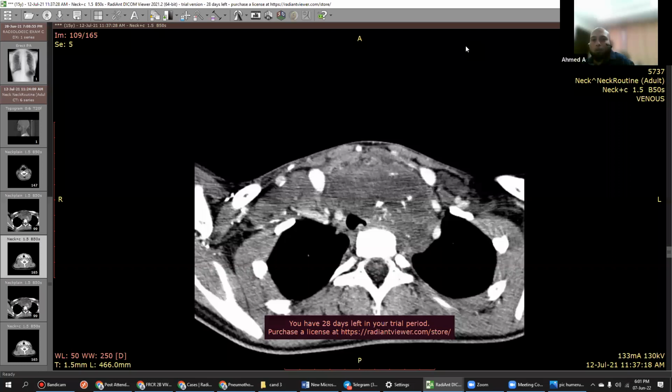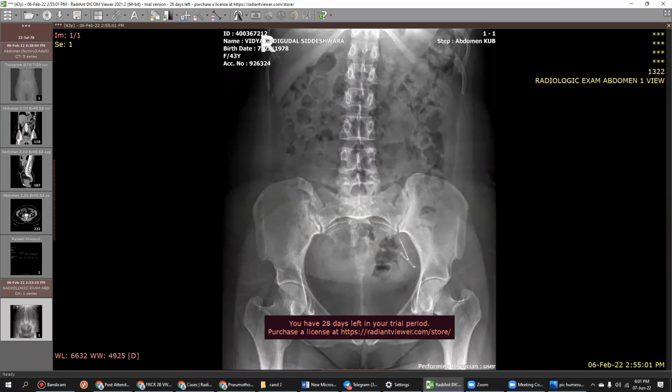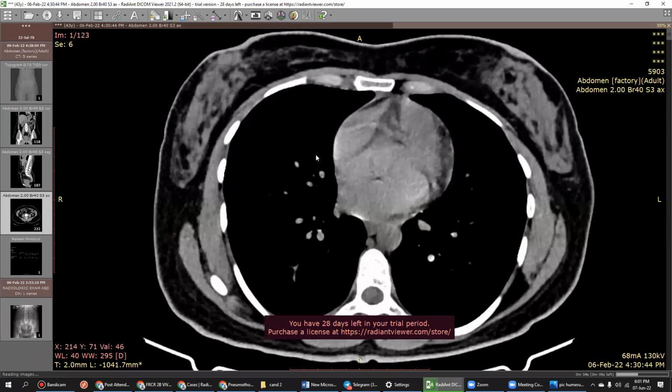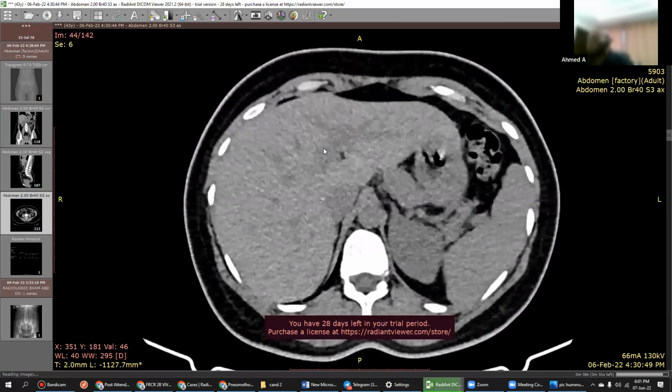Any cases I told which we'll discuss later? Yeah. Okay, left iliac fossa pain. Left iliac fossa. So that's a test of just seeing it. Okay. Now, can you see anything? Oh, this is a displaced IUCD. Yes. Okay. It was there. Left iliac, I think I pointed it out very much. Yes, it is a bit difficult.